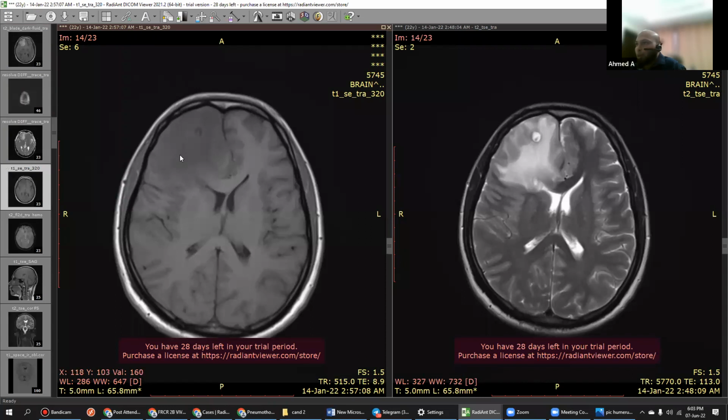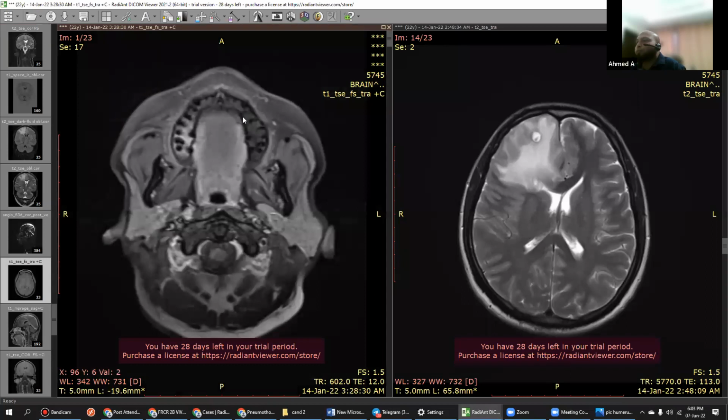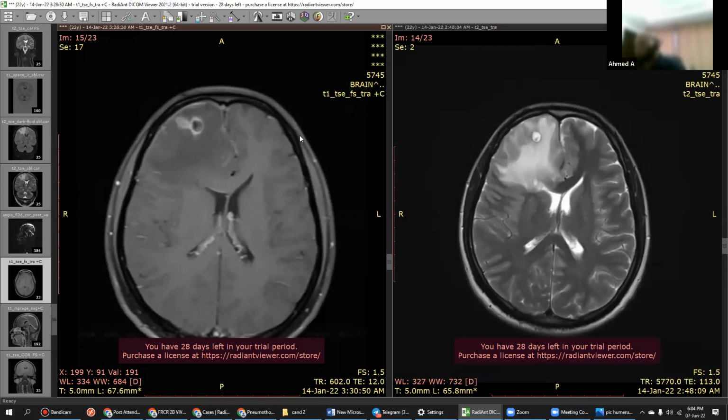So ideally, I have also not seen many cases with so much edema that will cause a bit of a misleading thing. But in which stage do you see more edema? Any idea you have of the stages? Stages of NCC. In the second stage. What are the stages? First you tell me what are the stages. One is vesicular, the first stage. Second is colloidal, and third is granular, and fourth is the calcified nodular. This is which stage? This is second. Good. Colloidal.